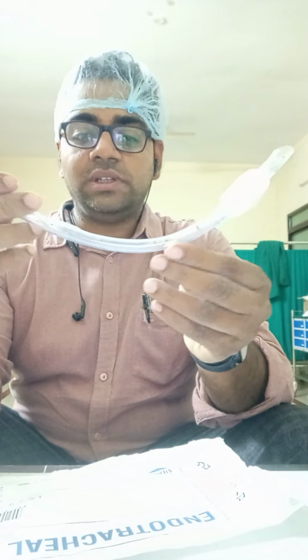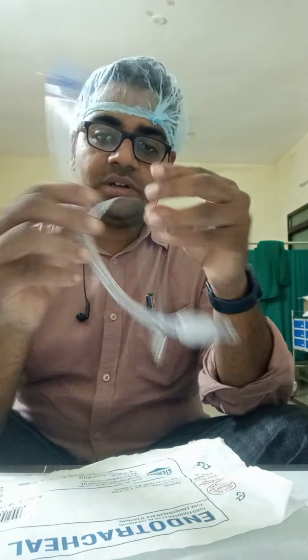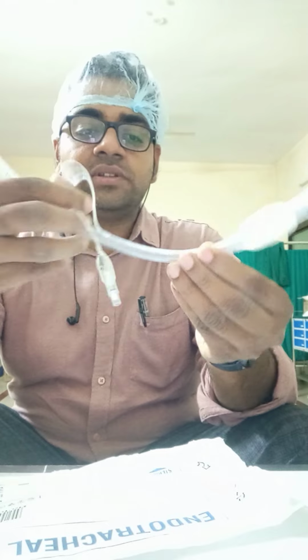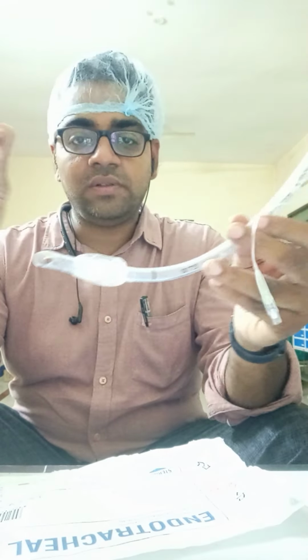Previously I have posted some videos regarding intubation. This is single use, meaning we usually don't reuse these tubes. These are sterilized by ETO or with gamma radiation. These are single use, so we cannot use this for all the patients.